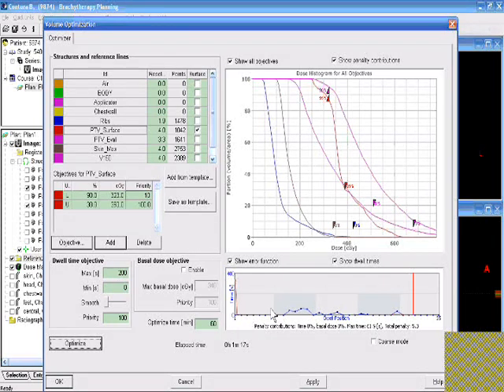That's good. This is the one, number 2, that's directed toward the head, and that's where actually the majority of the dwell times in this plan are. That's also good. This is the one toward the chest wall, and those are fairly small too. The one toward the feet, there are almost nothing here except for the one that is most posteriorly, and the one in the center, 0, nothing at all. So let's see what effect that has.